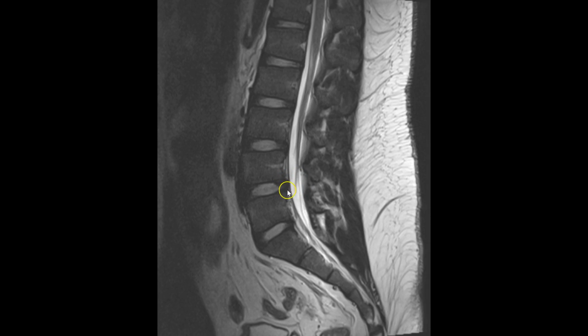Now, oftentimes, if you see extension of the annulus into the spinal canal, this is usually just indicative of age-appropriate disc bulging. It's very important we do not call, with few exceptions, disc herniations off of our sagittal images because they're misleading. Oftentimes, something that may look like a disc herniation is in fact just a disc bulge. Disc herniations do have a bit more clinical relevance than disc bulges seem to in the absence of clinical stenosis. So it's very important you appreciate that while this is normal in the sense that the annulus doesn't extend at all into the spinal canal, sometimes it will, and usually that's in the setting of disc bulges.